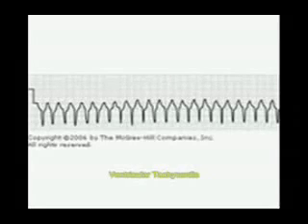Now this is ventricular tachycardia. In ventricular tachycardia you see premature ventricular contractions, 3 or more, and the QRS complex will be very wide. Whenever you see this, you should think of ventricular tachycardia. That needs to be treated. Otherwise it becomes serious.